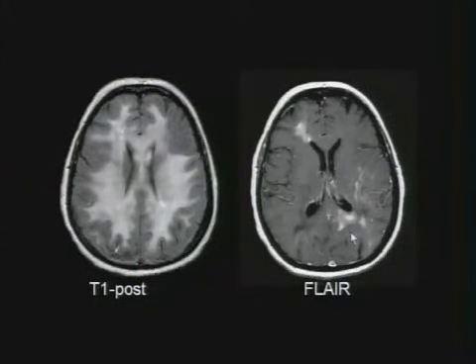Initially, this was called demyelinating disease, but this is actually B-cell lymphoma. A mimicker of all things, and also these tumors can be exquisitely sensitive to steroids. In our experience, we have actually seen lymphomas almost completely disappear after 2 weeks of intense steroid therapy. No other tumor will do that. So when you see a lesion that completely disappears, think lymphoma, obviously think demyelinating lesion as well.